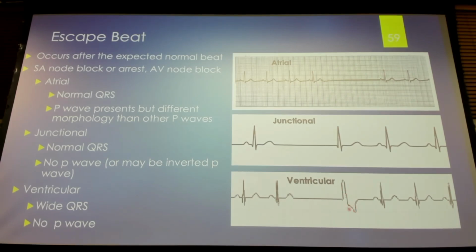You guys can see a little change here. Wide QRS, wide and ugly QRS complex. It hits you in the face, you can see that. If you looked at nothing else and you look at this, you're like, whoa, that is really wide. The rest of these don't really stand out, but that ventricular contraction is going to stand out.